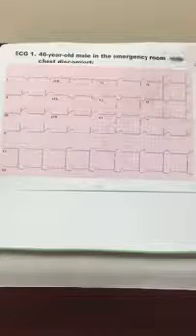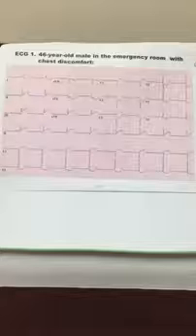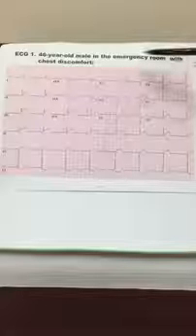So elevated ST segment is indicative of MI, which would go along with the Q waves that we see in those leads as well. So 2, 3, and AVF is going to correspond to an inferior wall MI, which is supplied by the right coronary artery. And then the elevation in V1 could be due to more of an interseptal MI supplied by the LAD, our left anterior descending coronary artery.